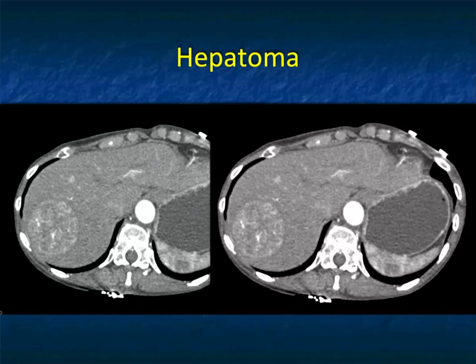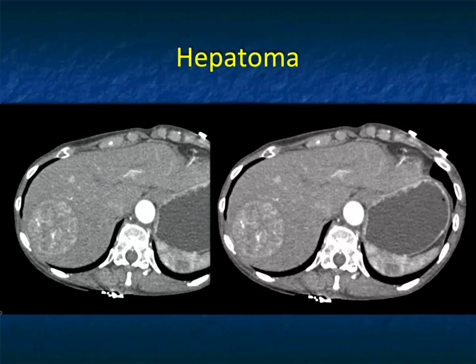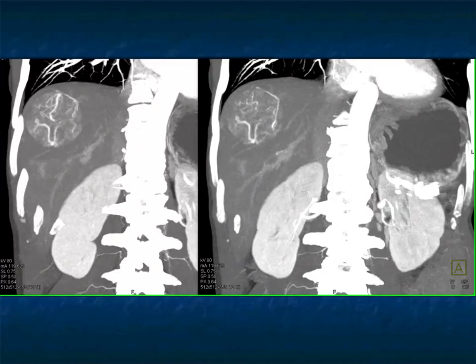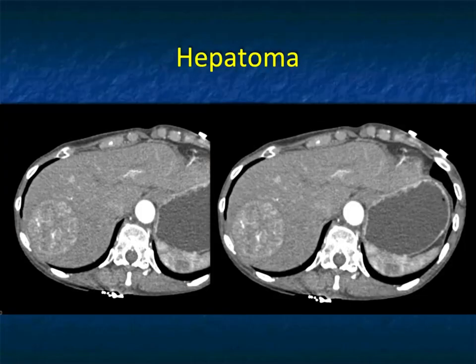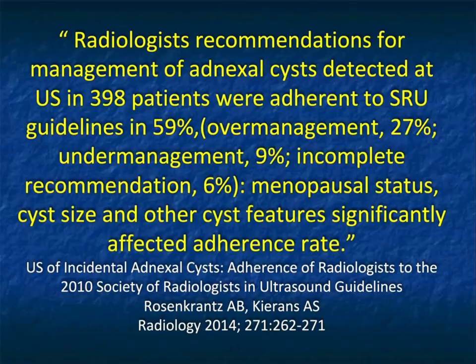Now you can see from this case, which is a hepatoma, how close the prior study looks. They look identical. This was hepatic adenoma, and this was hepatoma. So people are treating hepatic adenomas aggressively, and particularly solitary lesions will be resected. One thing we find helpful in creating the signature of a lesion is using MIP imaging with thin slabs. In this case of hepatoma, you can see the vascularity of the lesion on the axials, but it's better appreciated on the 3D mapping. Very nicely shown there.